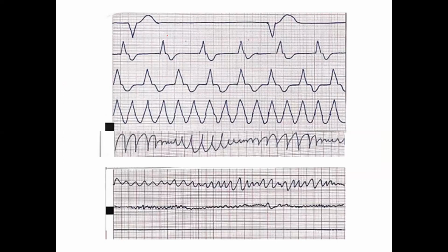Oh, this looks like a mess here. This is a problem. So no P wave. Do these QRSs look normal to you? Just mute your mics for a second. Thanks. Do these QRSs look normal? Then I'll stop talking. Go ahead. Are they normal? No. Okay. So what rhythm is this? Idioventricular rhythm. Between 20 and 40 is the inherent cadence.